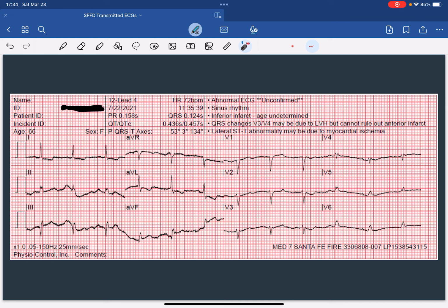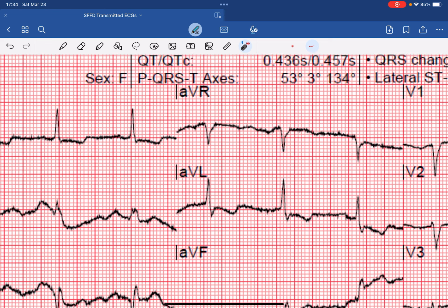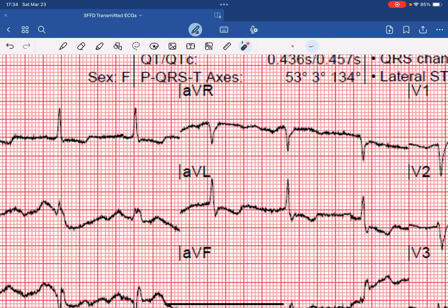And let's now interrogate this thing for ischemia. What you might be noticing is there does appear to be some ischemic changes. Your eyes are probably gravitating towards lead 1 and lead aVL. If we look, we can see that the ST segments in both of these leads do appear to be depressed. Now, again, the isoelectric baseline is a little bit wavy, but there are some characteristics of ST depression that are not necessarily going to be altered too much by a wavy isoelectric baseline.